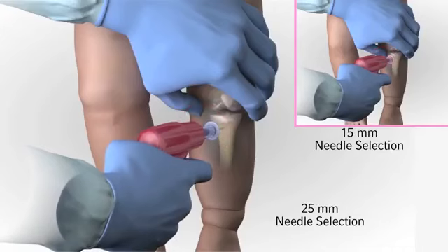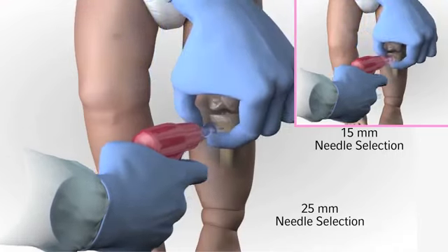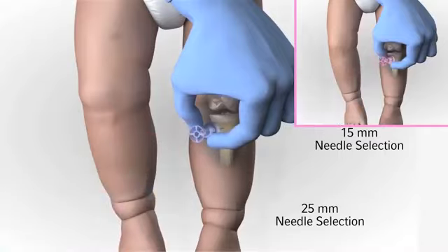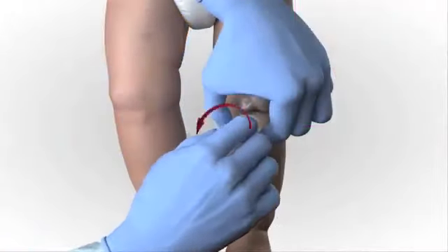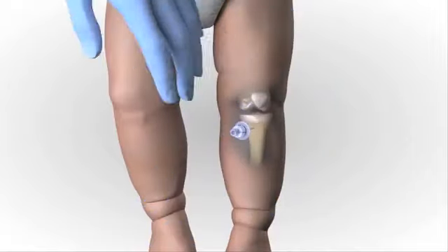Gently drill. Immediately release the trigger when you feel the pop or give as the needle set enters the medullary space. Avoid recoil. Do not pull back on the driver when releasing the trigger. Hold the hub in place and pull the driver straight off. Continue to hold the hub while twisting the stylet off the hub with counterclockwise rotations.